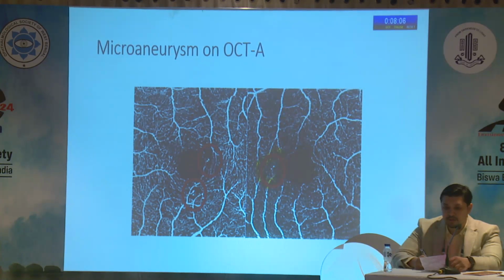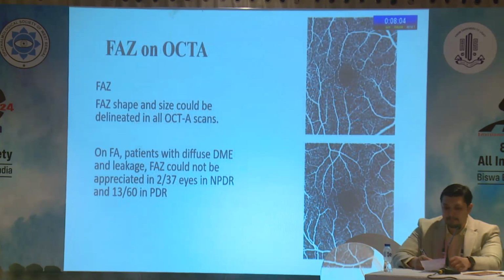diabetic retinopathy. Another such patient, so that keeps on happening. But again, because there was no clinical diabetic retinopathy, we did not do FFA to confirm if they were actual microaneurysms or not, because FFA remains the gold standard for the diagnosis of microaneurysms.